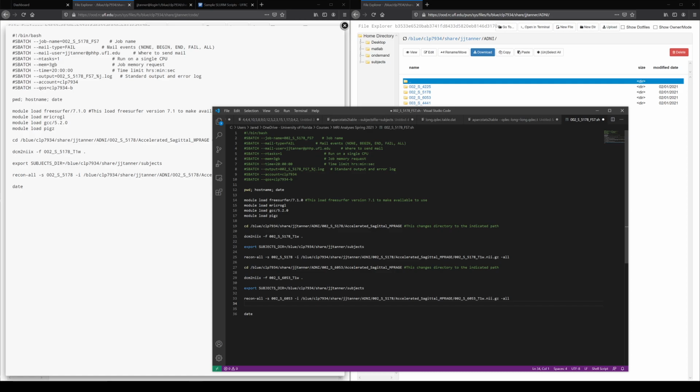Or you could use a for loop. But the problem with that is you might forget to change everything, or it takes a while. If you only do it for 2 or 3 brains, it's not an issue. But if you have to do this for 100 or more, or even more than about 5, it's going to take a while, and it makes the script really long and hard to track.